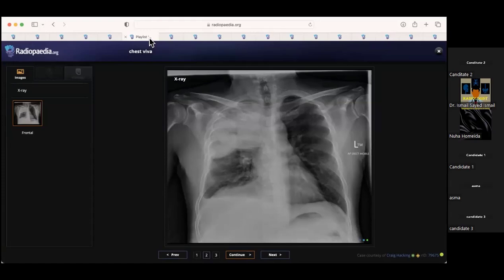I can see in this opacity an area of lucency centrally. I don't see a typical air bronchogram. In my routine practice, I will window this to confirm if this lucency is branching, with the pattern of an air bronchogram, in a patient who presented with a history of cough and fever. The main consideration is an infectious, inflammatory process with consolidation, as a pneumonia. If there are any previous images, I can compare with them. If there are no previous images and this patient has raised inflammatory markers, the main consideration is a pneumonia.